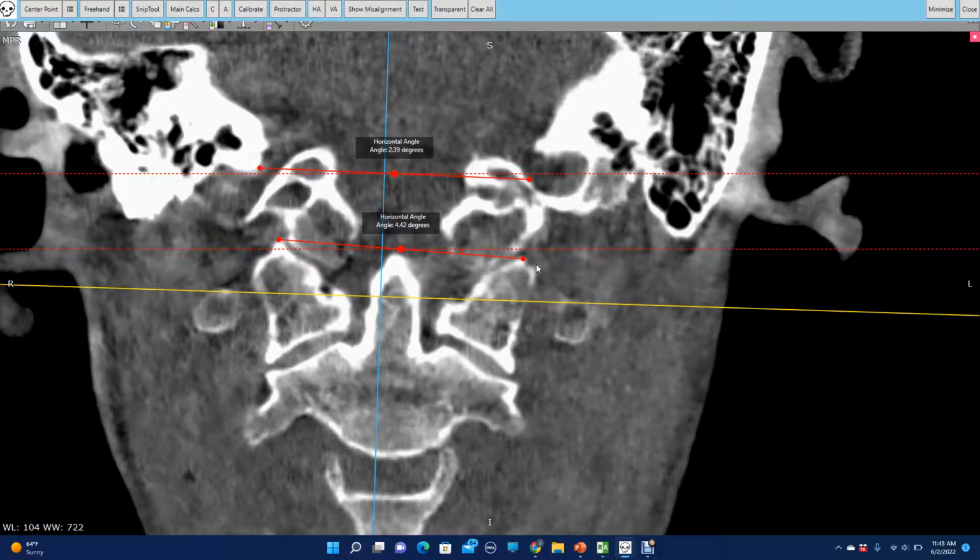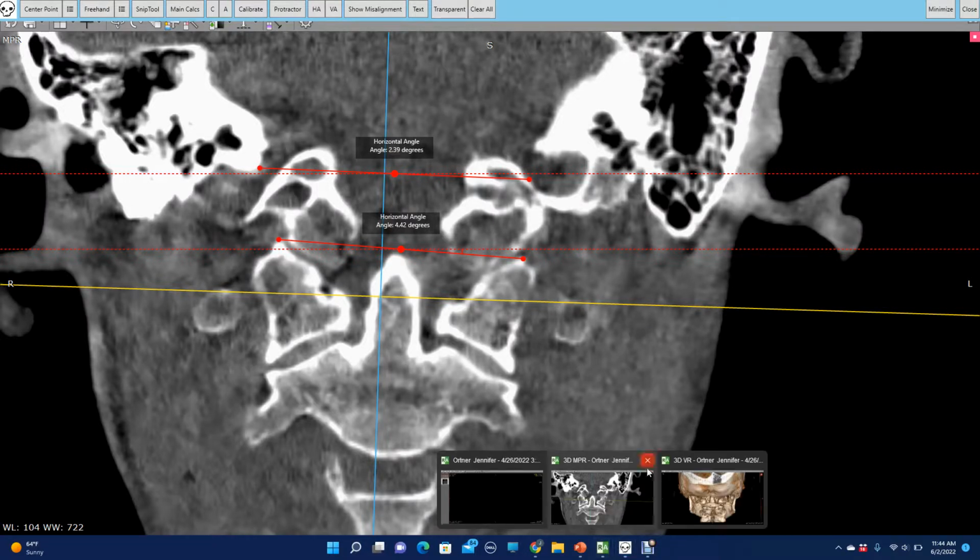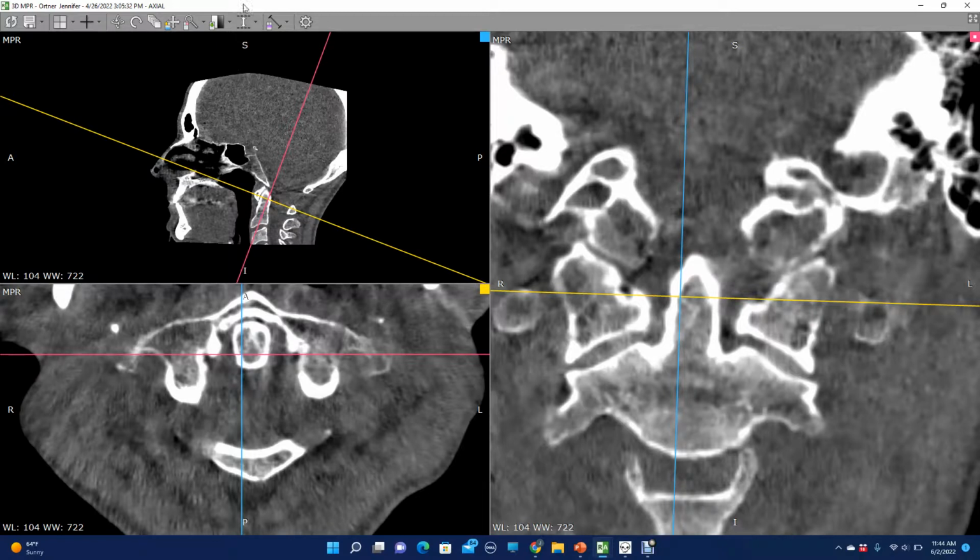Over 2 degrees. See, this is what I'm saying, is we can't just look at these cone beams without modifying the perspective we're looking at it. And right now I've been doing things on the perspective of traditional filming, where we look at it through the middle of the skull without tilt on the horizontal, and we look at it through the frontal without rotation. But when we look at the frontal, when we're rotated through the atlas, it changes the measured plane line because we're viewing different parts. And so I think the workaround for now is that we do a thicker slice.